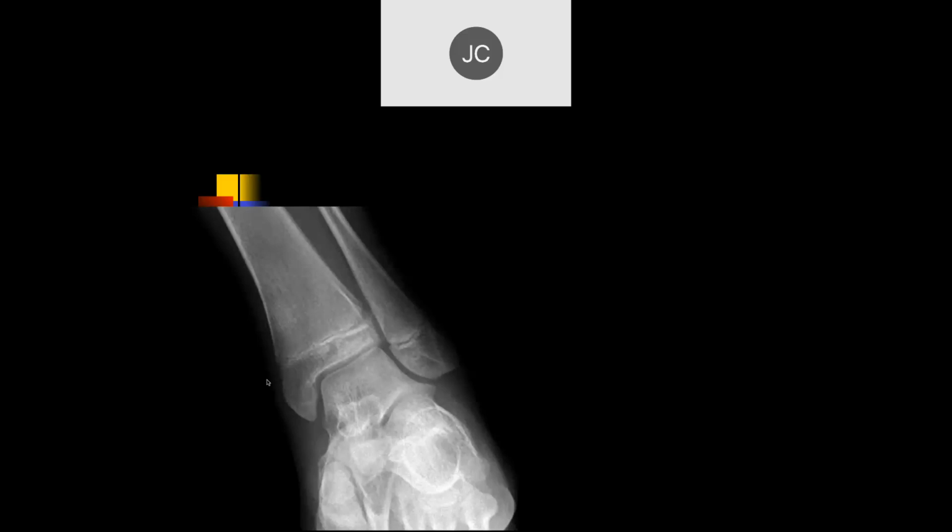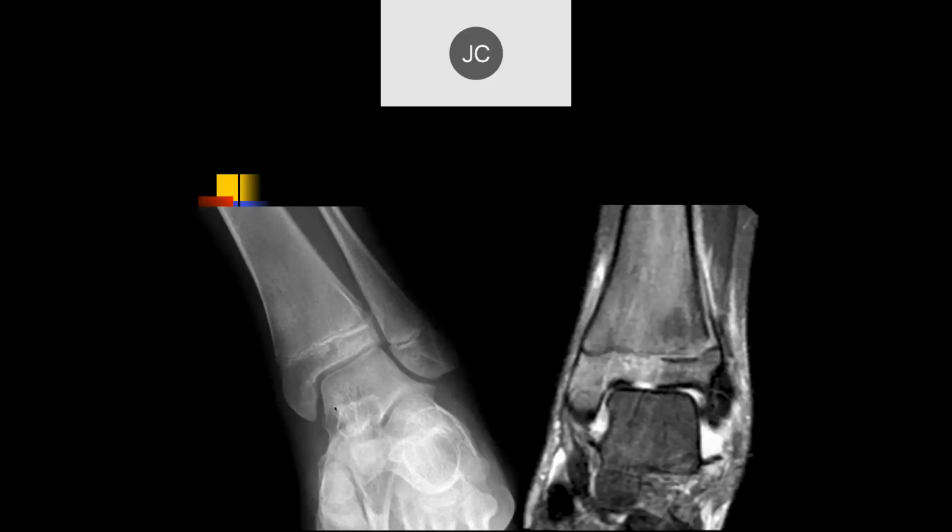Okay, radiographs of the ankle. I think we're looking at the tibial plafond in the middle. There's a lucency there. Maybe a little, yes, and some widening of the physis. So, yeah, fracture and the Salter-Harris 3.